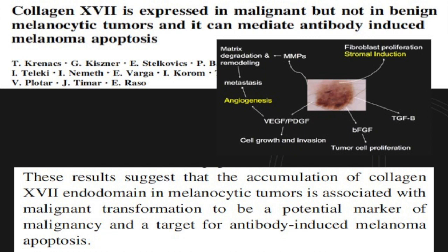And it turns out that people have started to look at this phase of melanoma progression and have found that it's collagen 17 that is being laid down for this melanoma to grow. So it is highly likely that many of the crystalline structures, these shiny white lines that we are seeing, are actually this collagen 17 being laid down with this communication between the melanocytes and the fibroblasts.